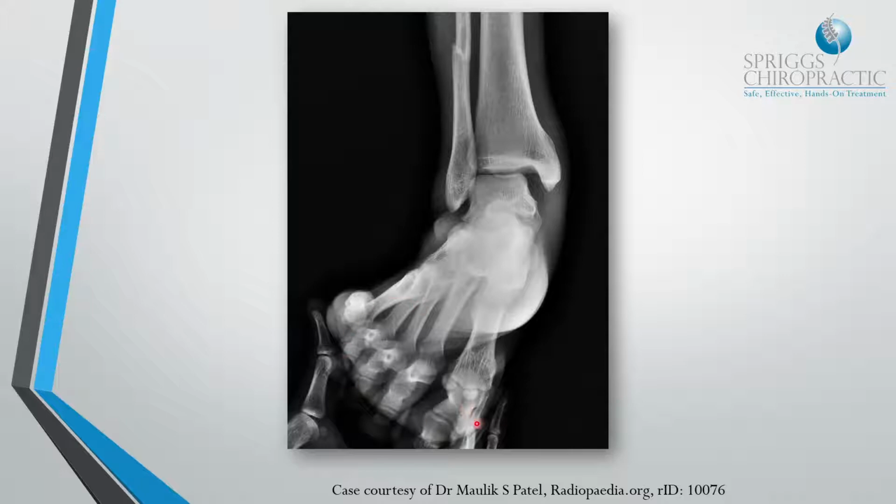But here's an example of that stress film I was telling you about, where this is going to be the evaluating person's hand, and you stress the ankle into the direction where you want it to go, and that may reveal more details about what injury has occurred, and of course allows you to assess ligamentous integrity. So to get widening of a joint space, you will have to have ligamentous disruption and ligamentous instability. So here we are on an X-ray, so you can diagnose that type of injury using the X-ray.